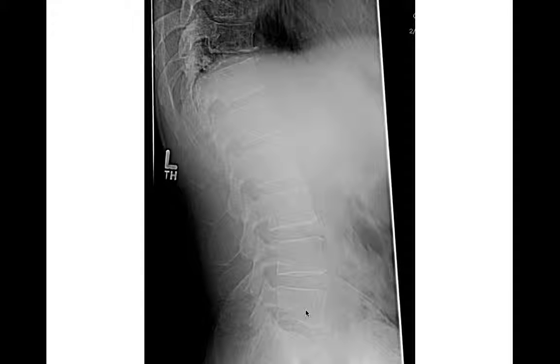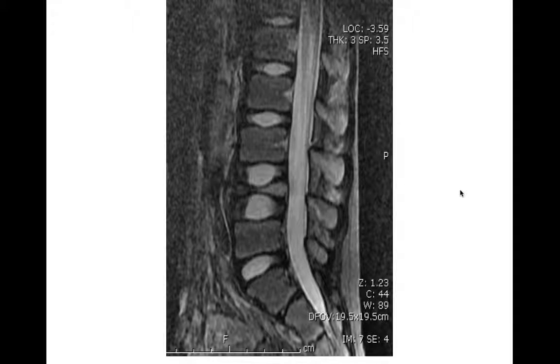All right, next we're going to talk about a brief differential for vertebra plana deformity. A radiograph which shows the vertebral body here, which is nearly completely flattened, and there's focal kyphosis here. So a nice example of vertebra plana, and there is a kind of classic differential diagnosis for a vertebra plana. This one, in this case, was multiple myeloma, which is one of them on your list for differentials.